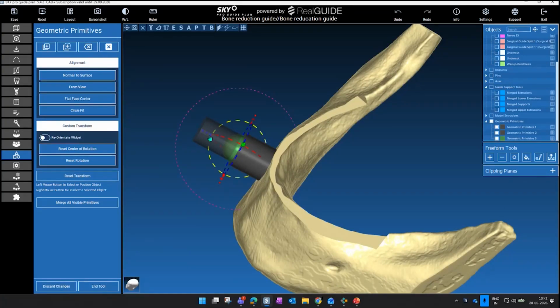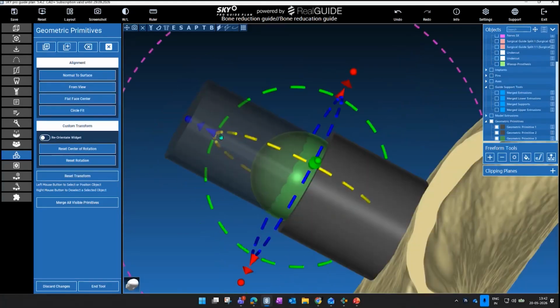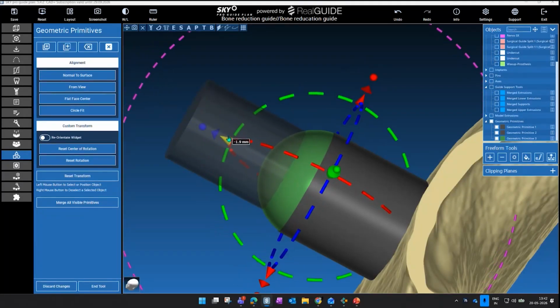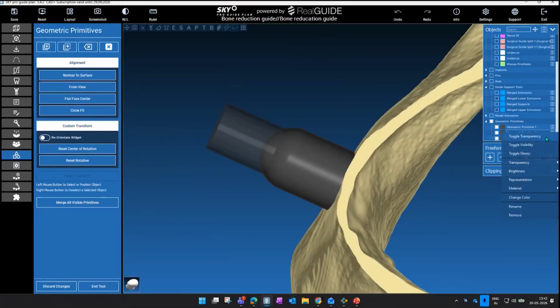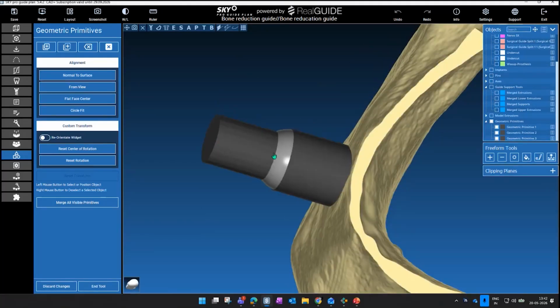I can select this bigger arrow to pull it out, and then increase the radius of it, pull it a little down. Then right click, and again make it opaque. So you have something like a smooth transformation from here to here.